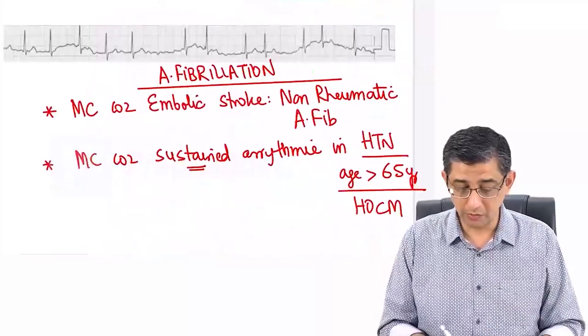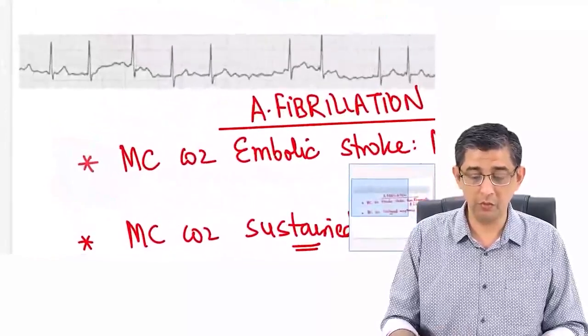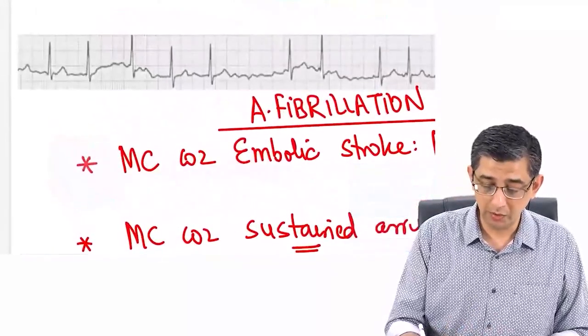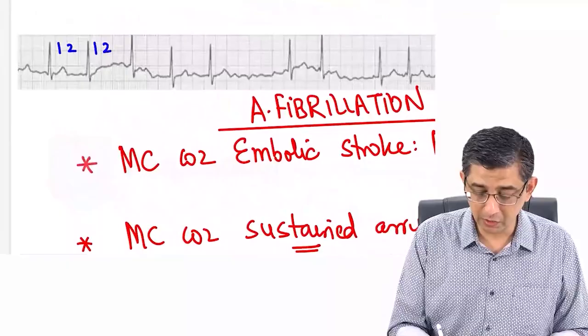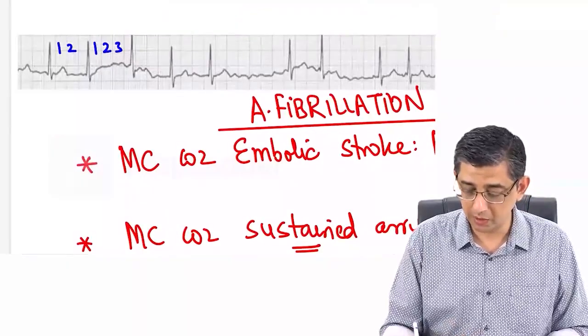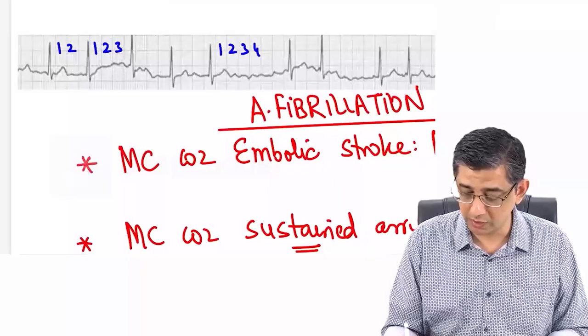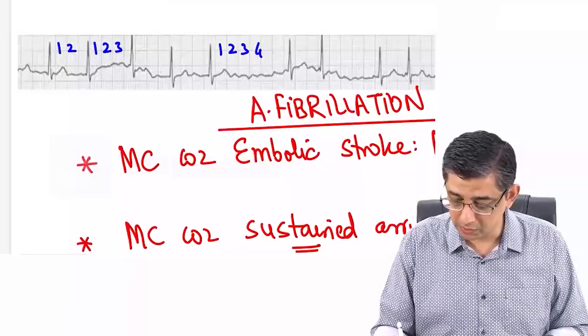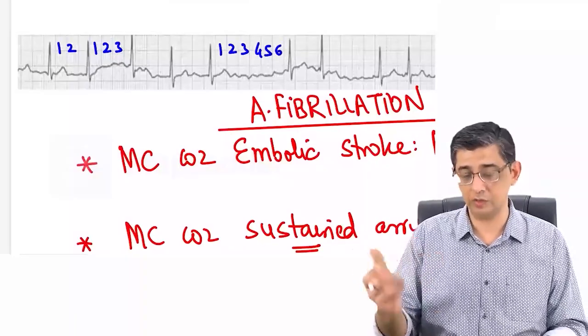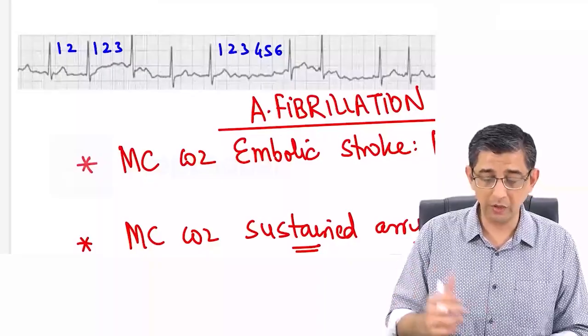So I'll just focus on the ECG that I showed before you earlier, and I want you to notice that if you look at the number of the large squares which are present between the R and the R waves, I'm just highlighting those large squares which can be easily deciphered by you, because lots of time I understand the resolution issues can be there. Now look at the huge disparity.